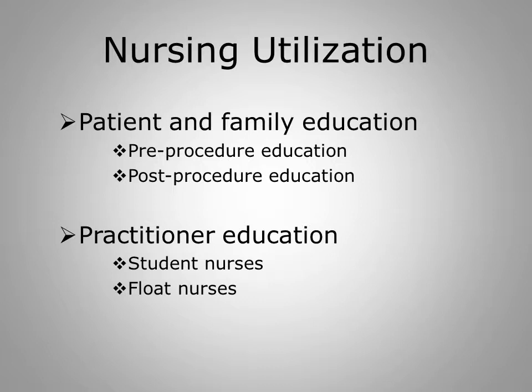Imagine having the ability to sit down with a patient and draw step-by-step details which allow them to have a visual understanding of the procedure for which they are about to sign consent. The period after the procedure is an extremely nervous time for patients and family as well. Using drawMD, providers can quickly provide detailed illustrations of the end result of the procedure.